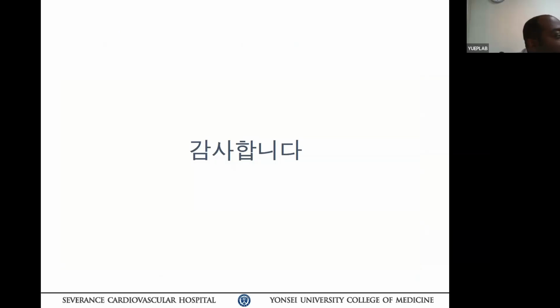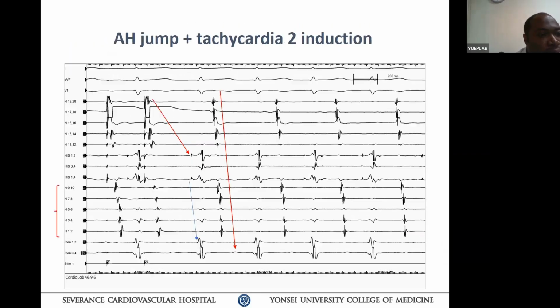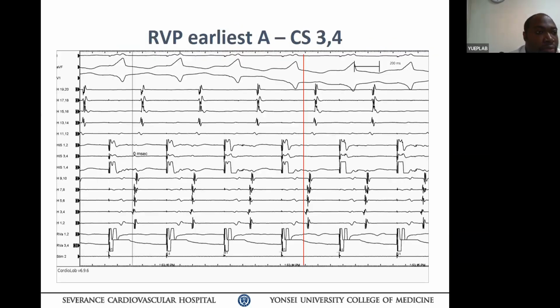Question? Can we go back to your first tracing? The first sinus, yeah, first sinus, and then let's go down to the tracing. You had the jump and the induction of tachycardia. Okay, next slide. Let's see the pacing.